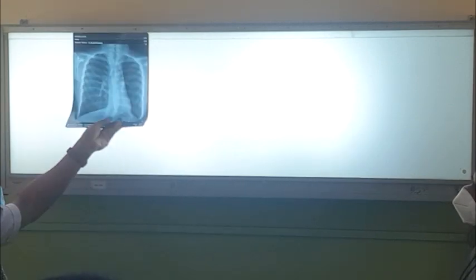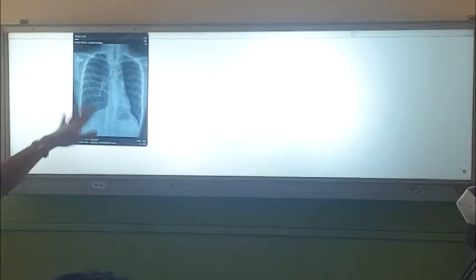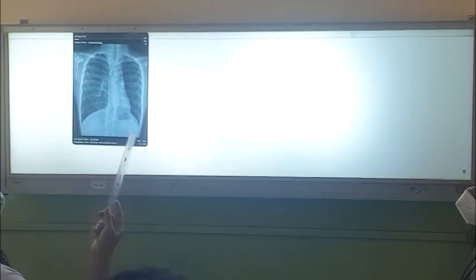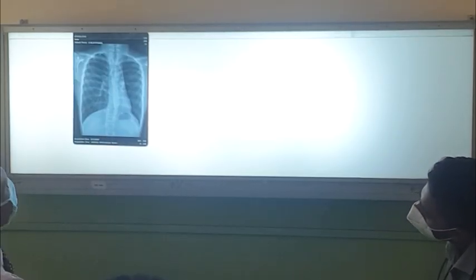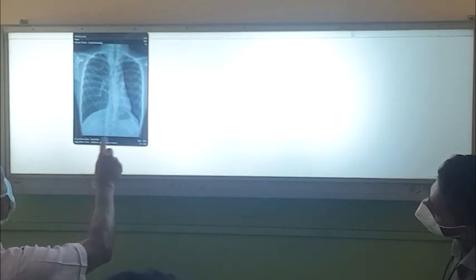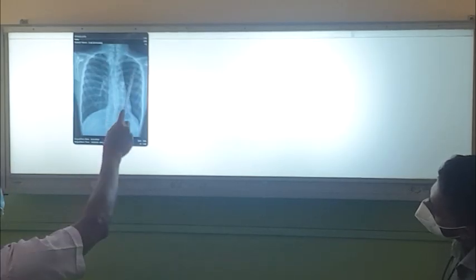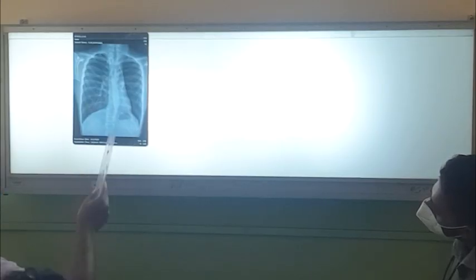This is a young patient who came with recurrent chest infection, a 13-year-old boy with recurrent infection from the time of birth. Right here, you can't see the right heart border, it is shifted there, and this is an emphysematous right lung, even coming up to this level, and this lung is darker than the other, a little bit rotated, and less vasculature here, right?